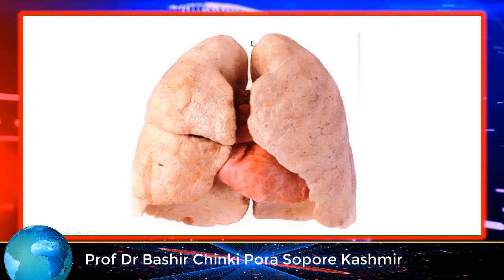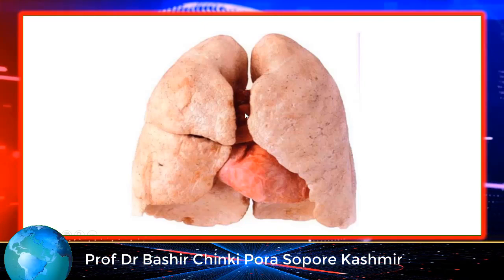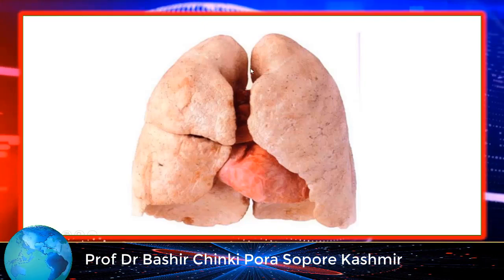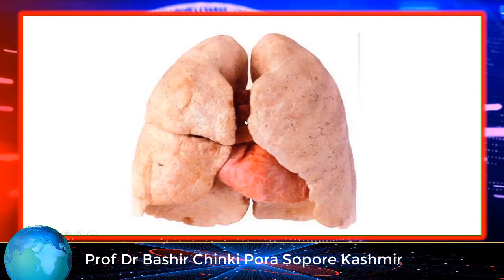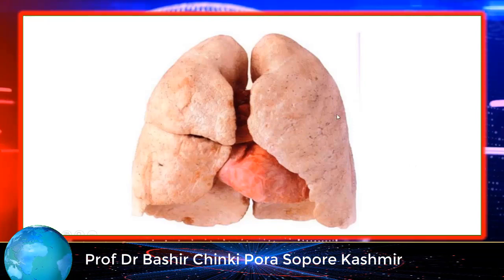And you can see there is an empty space anteriorly as well as posteriorly, and it is in the mediastinum, because the central part will be the mediastinal part.